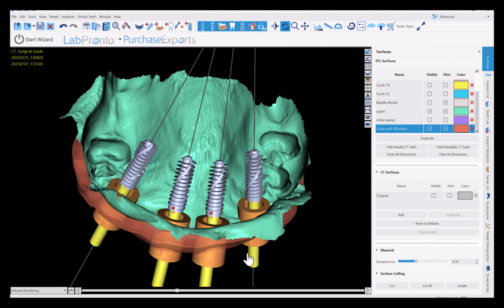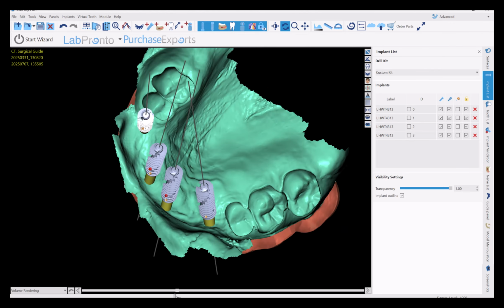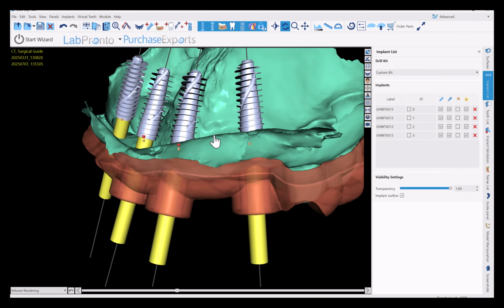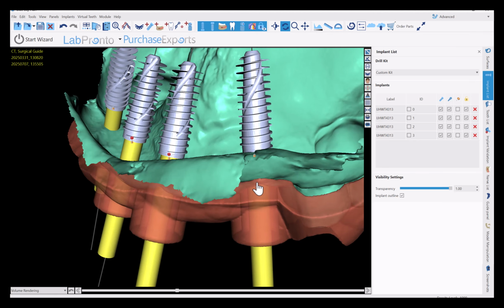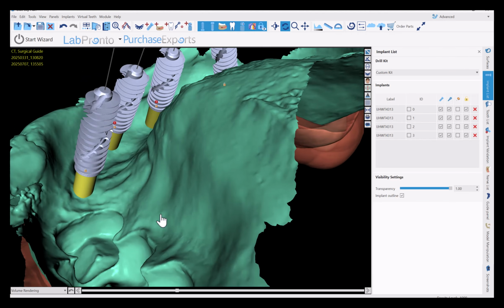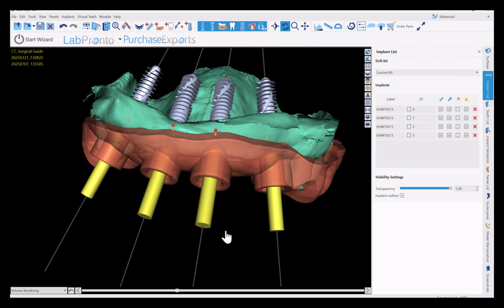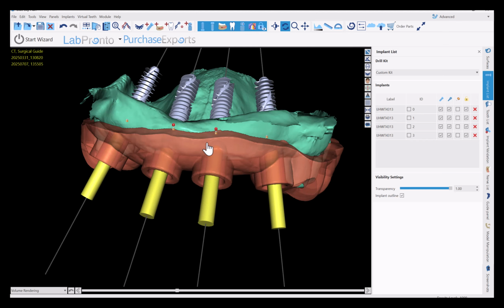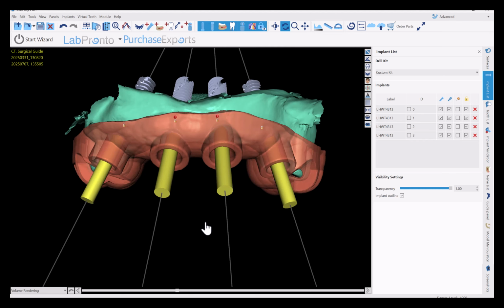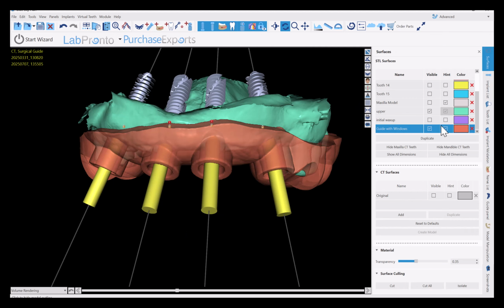And now, again, you see my tubes extending through here, but if I now go and hide my guide tubes, remember the software knows that should not impinge into the tissue, so it's trimmed that back. The actual guide, even if you were to do this flapless, which I wouldn't recommend, will not impinge in there. And so we'll probably take a handpiece and trim this back more so that we can lay a flap, we can reflect all this buccal, and then the guide will actually kind of hold the retraction of the flap.